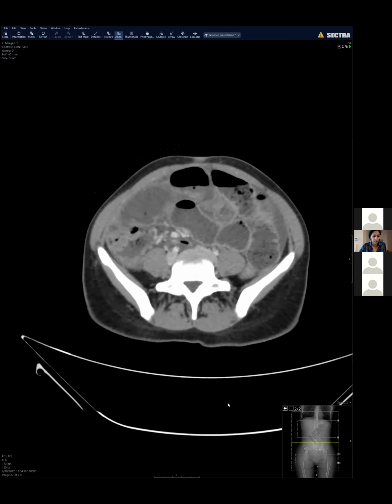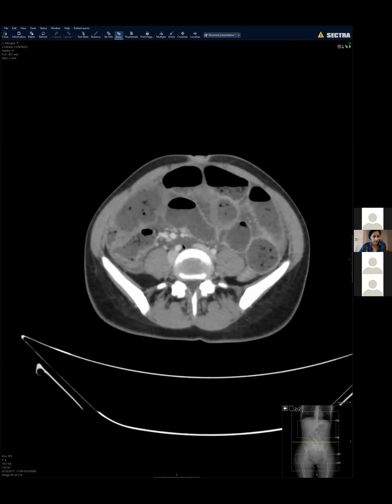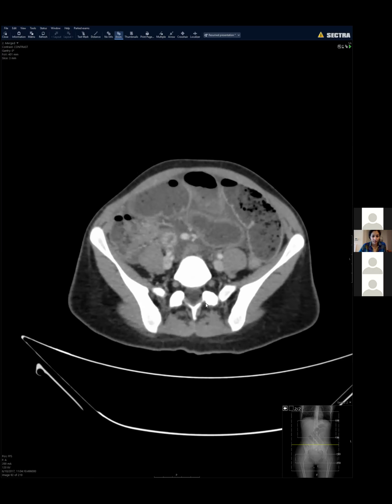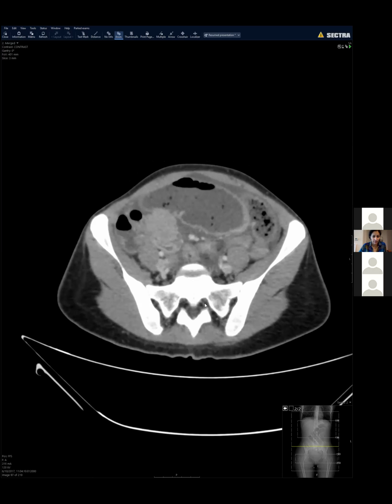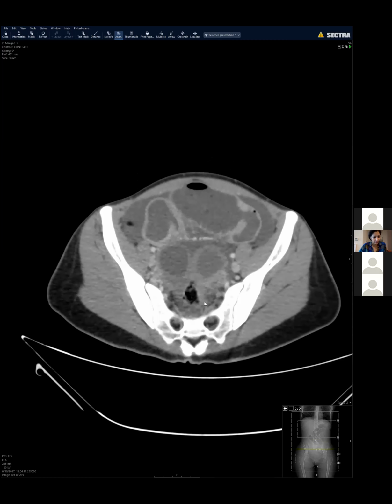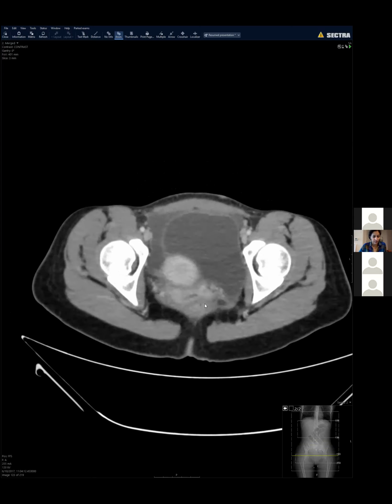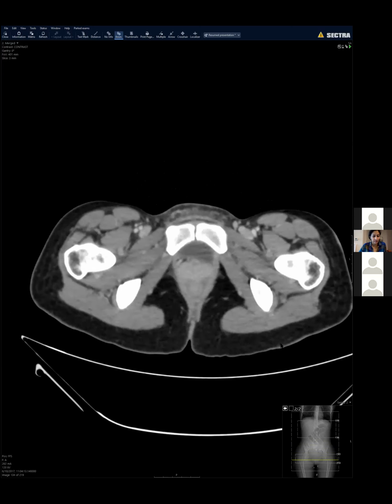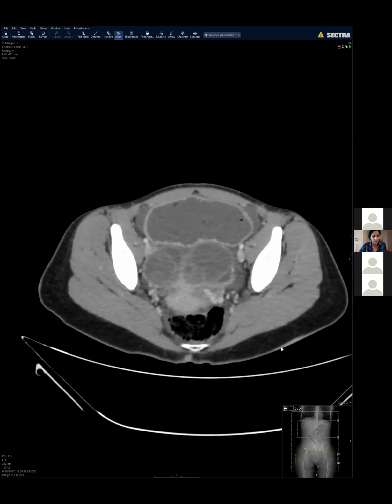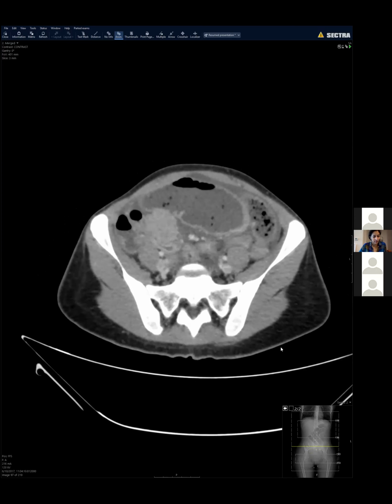Young patient with bowel issues, appendix is always good to see. So here's her appendix. It's always hardest to find the appendix when you need to, it seems like. And then here are some more dilated bowel loops, bladder, and we're done. I'm going to stop at this image. Any thoughts? Anybody wants to chime in?